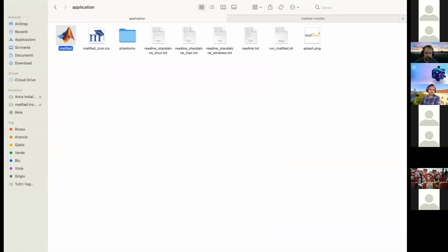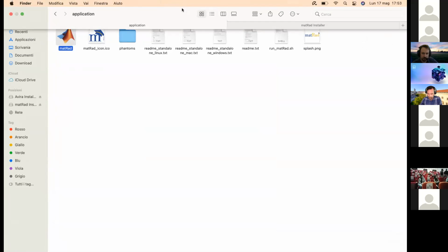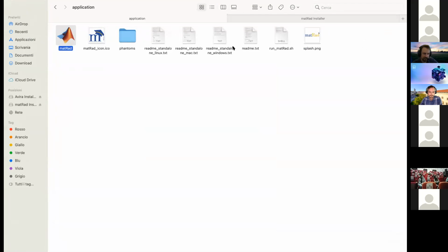Yeah, in my case, it took 30 or 40 seconds the first time, because the system behind it caches some files and so on. So it usually takes a while the first time to open it, and then suddenly it becomes much faster. If it doesn't work, as Hans-Peter already said, the best way is to use right click and open.